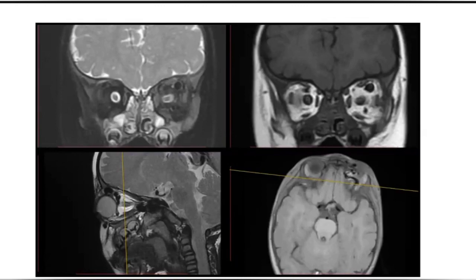All right. And what about incidental images? Can you appreciate those signal areas? Yes, on sagittal images, there is a linear hypointense signal which is extending to the inferior wall of the orbit. Exactly. All right.